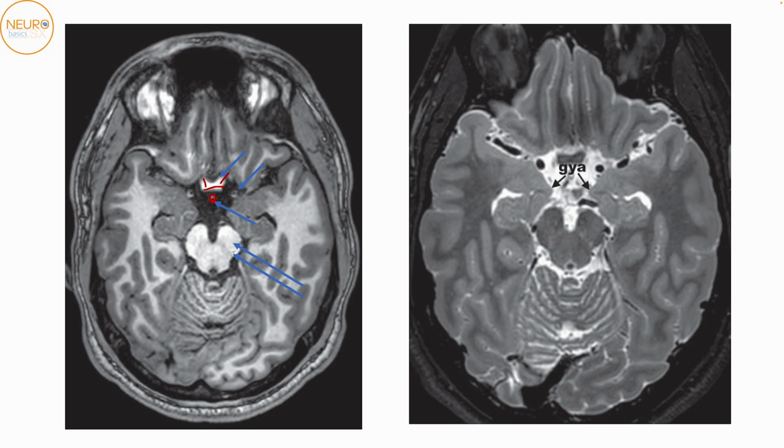This here is, as we've already discussed, the T1 hypointense structure. There's the substantia nigra, and this is the crus. Apart from that, we're also able to see the structures of the medial temporal lobe. We know that this structure in contact with the cerebral peduncle is the uncus. The uncus has an anterior border and a posterior border. Along the anterior border, you have the amygdala. Along the temporal horn is your hippocampus. So you will identify the amygdala and the hippocampus on axial imaging now.